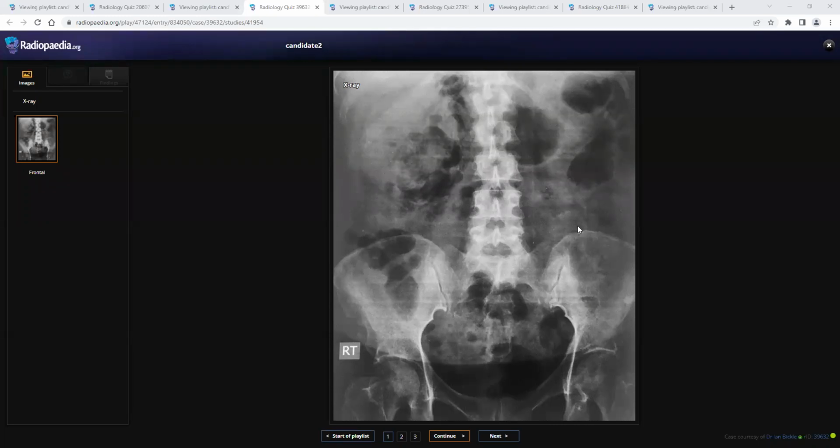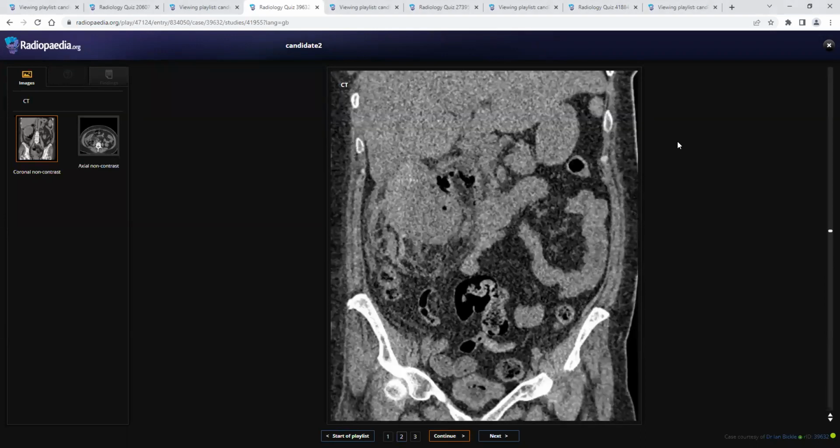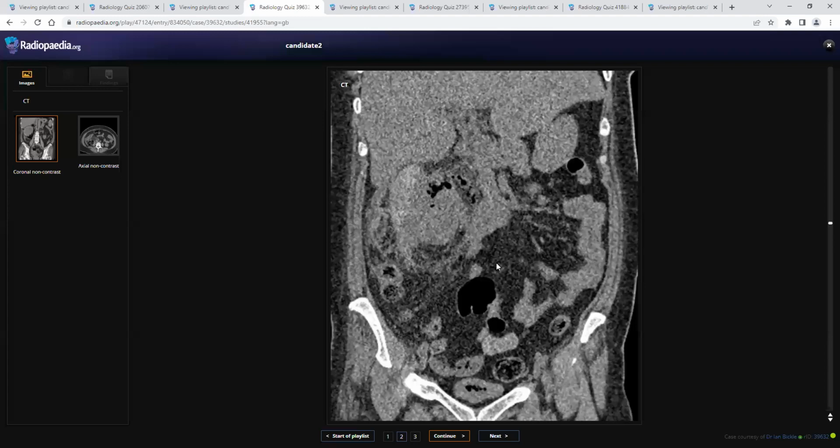Okay, yeah. Before CT, what do you want to ask the clinician? One, the history. What do you want to know? If the patient is diabetic? Yeah. Okay. As you asked, CT is here. You can just scroll. I will ask for remote control. Yeah. Click on the center of the image and start scrolling.